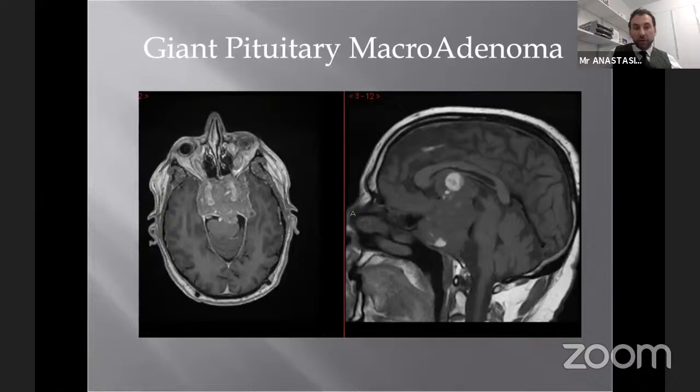So we did, very cautiously, safely and quickly, an endonasal biopsy for histopathology because the tumor was protruding within the nasal cavities. And probably you can identify there are 2 shunts placed in order to treat the hydrocephalus, from the artifact on the axial MRI. On purpose, I have the T1 sagittal up here in order to demonstrate to you that bright signal. It's hemorrhagic components of the tumor, and this is what you can see on the T1 without contrast.